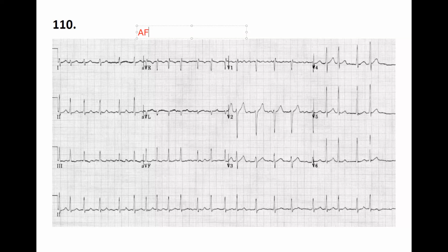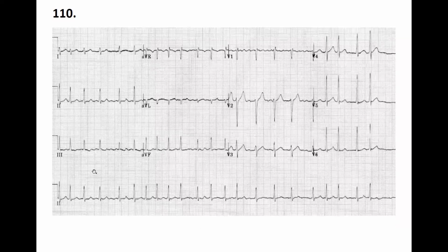The P wave should be symmetric and equal to each other. That means sinus, but this is not, and very fast. This is why it's AFib, okay? That's arrhythmia absoluta. And without P wave, because that's a fibrillatory wave, that means atrial fibrillation. Good.